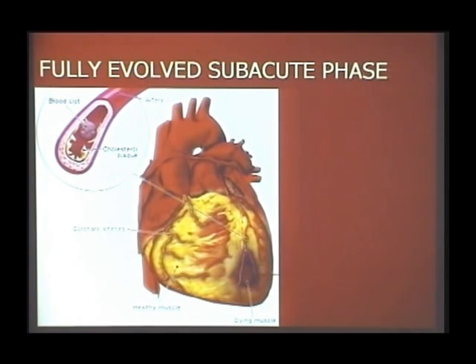So you have a central area of necrosis which will continue to produce a pathological Q wave. The surrounding area of ischemia will produce the T wave inversion. So at this point, the ST settles down, isn't it? The ST settles down because the injury is cured, injury is treated.